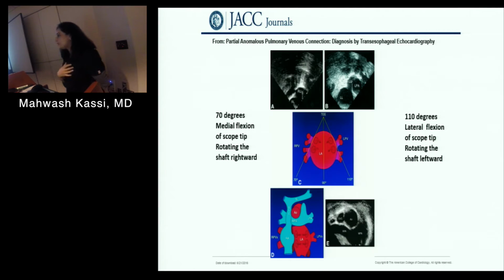This is kind of the bane of my existence. I have difficulty finding pulmonary veins most of the time, and always the attendings take over. But I think this might be a helpful little tip to figure it out.